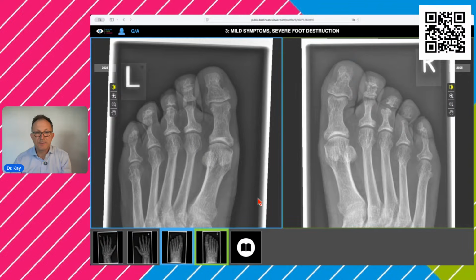I would say yes, because you see interphalangeal joint, distal interphalangeal joint, proximal interphalangeal joint, but here, no joints, no joints. And even this bone should look like this one. It's atrophic. So this is a pencil and cup deformity, a mutilation that we see in psoriatic arthritis.